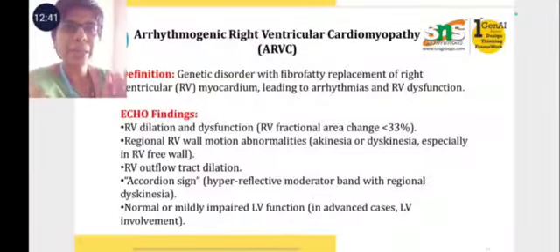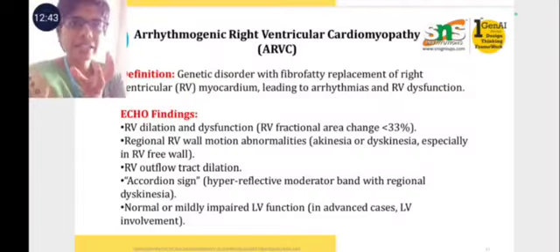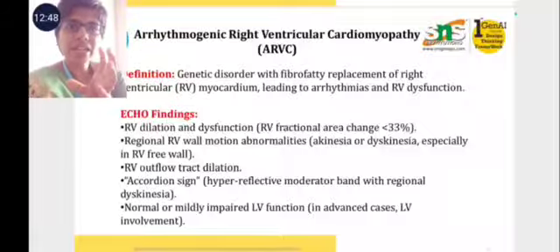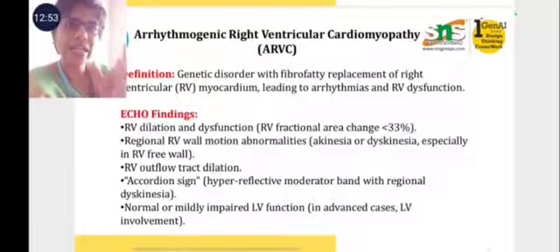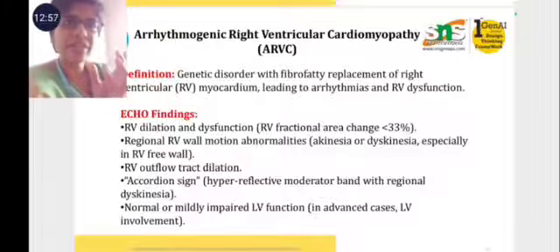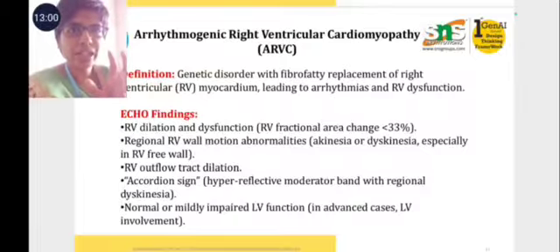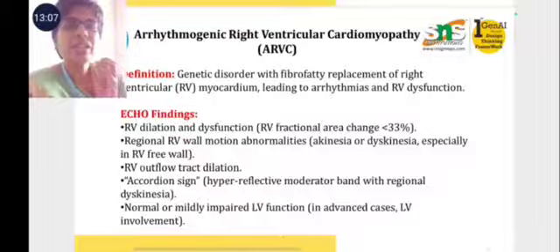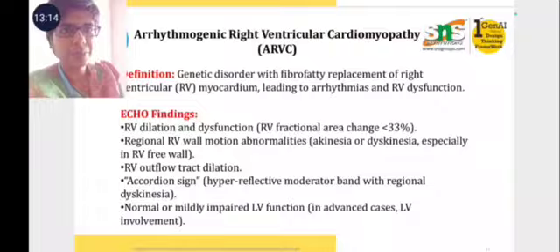Why is it mildly impaired? Once the right ventricle gets dilated, the pressure in the right ventricle gets increased, and volume also gets increased. It starts to push the LV. Once it tries pushing the LV, the movement is called jerky septum, IVS. That is impaired contraction, and also the septum gets jerky. Normal contraction is absent. Jerky or bounce movement. Jerky septum IVS is present.